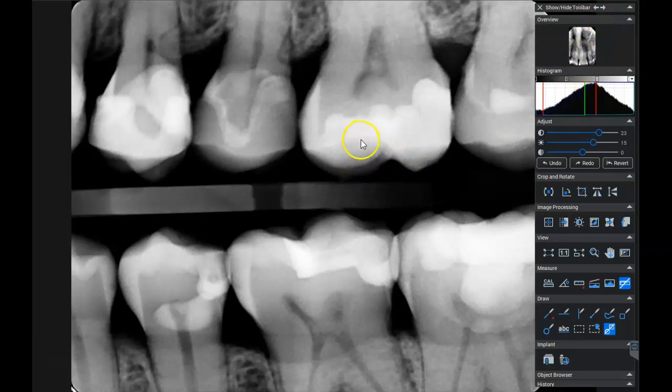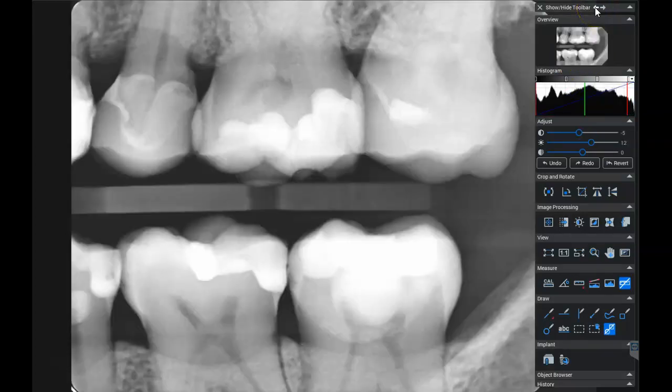But sometimes in going back to a different image, as I just went back, I hit the back bar and I went back, but alas, using this arrow to go back to the image I was on does not show that image in the thumbnail. If I go back again, then it shows, but when I try to change with the mouse, right clicking, moving the arrow around, as it shows here, there are changes being made, but it's not to the image that I'm on, it's to the image in this thumbnail.